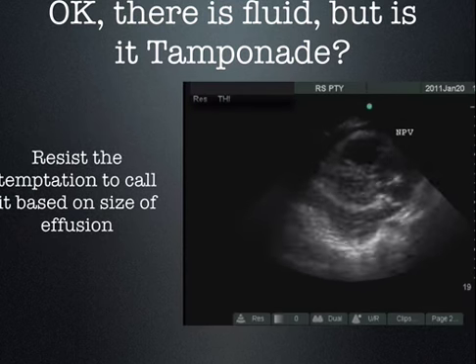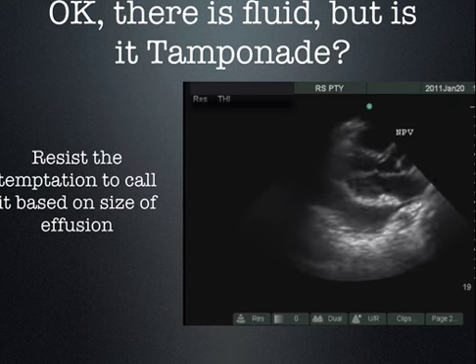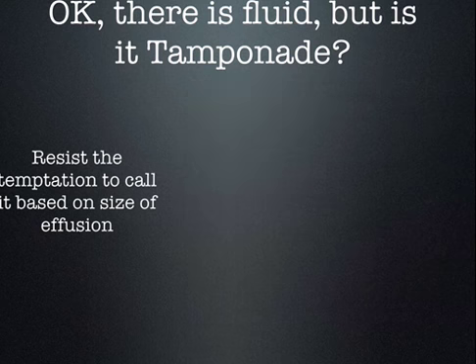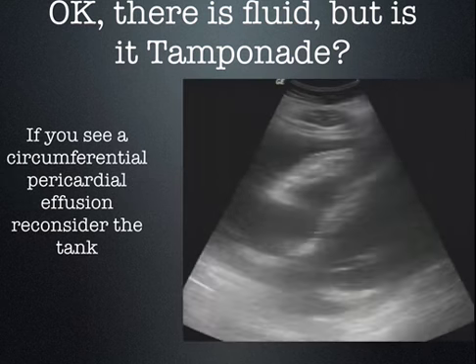All right? So I want you first off to resist the temptation to call this tamponade just because of the size of the pericardial effusion. Let's have a look at this one right here. And then I'm going to tell you how I like to use ultrasound to differentiate.